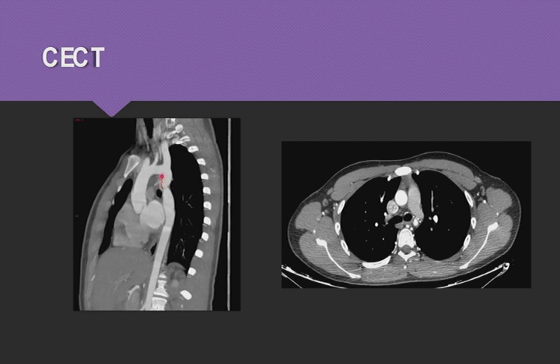This narrowing was about 27 millimeters from the origin of the left subclavian artery, and at the maximum stenosis site, the measure was 5.5 by 3.5 millimeters.